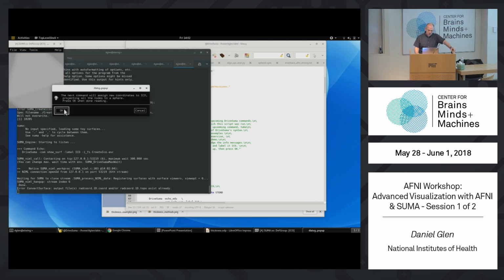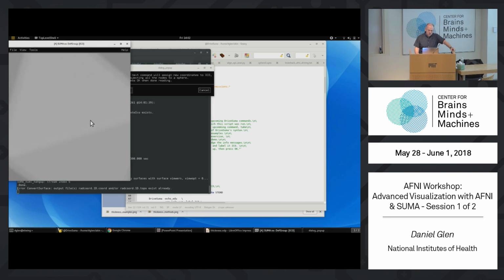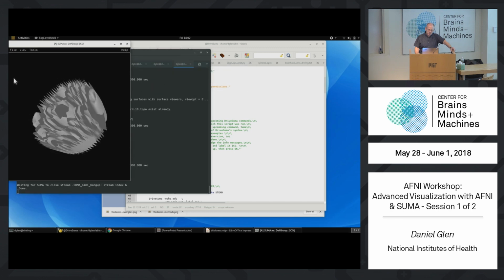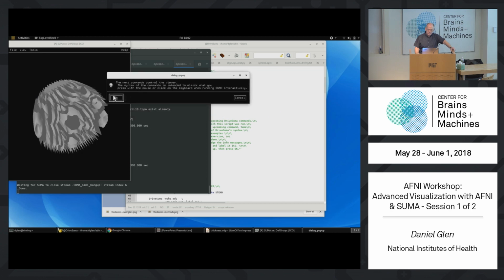Okay, this has loaded our icosahedron, our simple one. It's a little difficult to see because it's zoomed in so much, but here's a simple icosahedron. It's going to be reprojecting all the nodes onto a sphere. So here our nodes are moved out, and then another coordinate assignment for those nodes. So it looks very different, still the same topology. And now it's going to control the viewer.